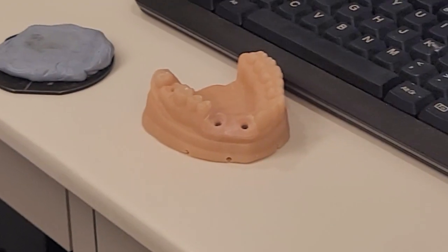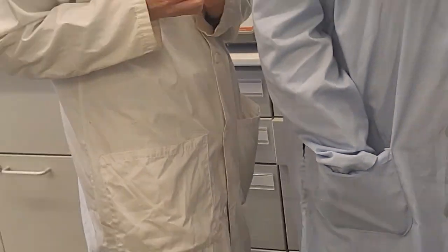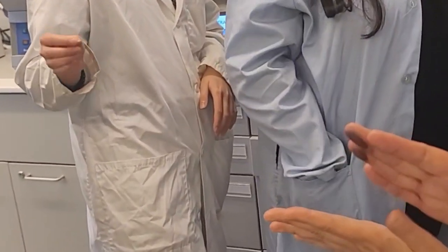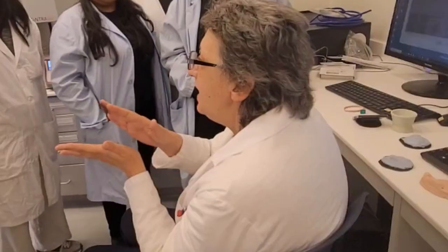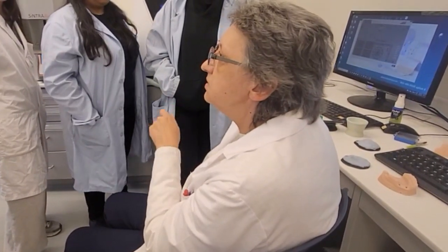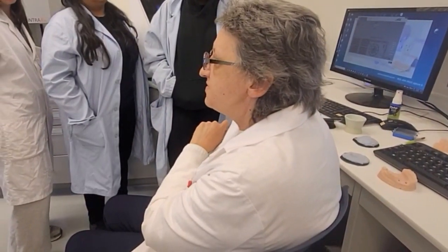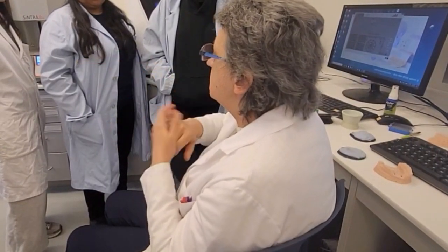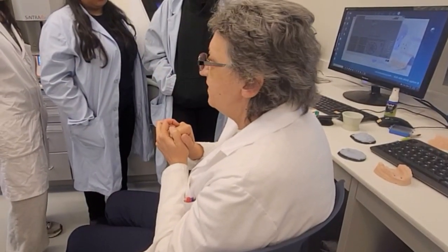So a scan flag is a piece of an implant component that is only for the digital component. And if you look at it, you see it has a little cut on the side, right? And that's typically for this type of implant: bone level, Straumann, regular CrossFit. Okay, if I use Straumann wide, that might be a different design on my scan flag.